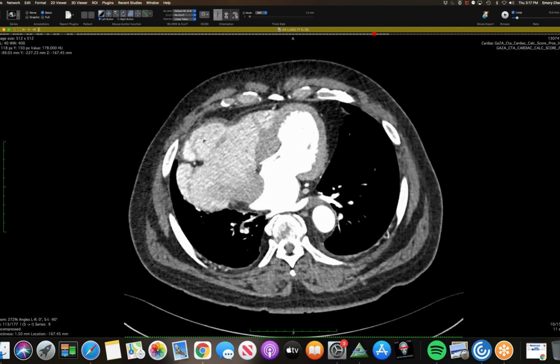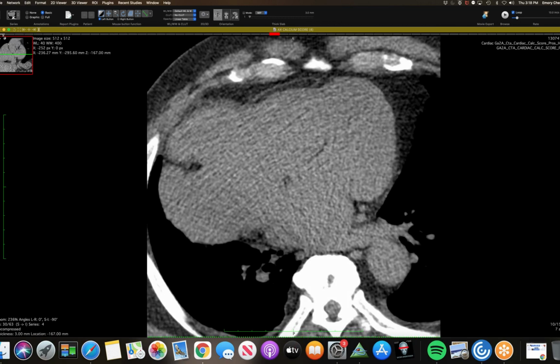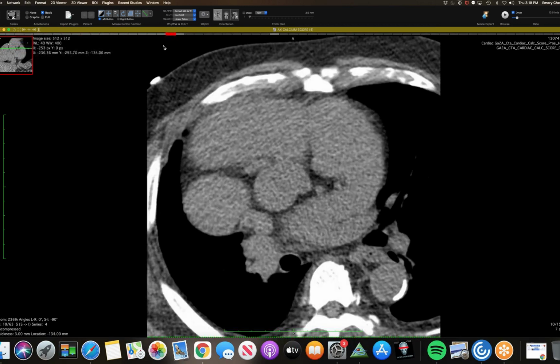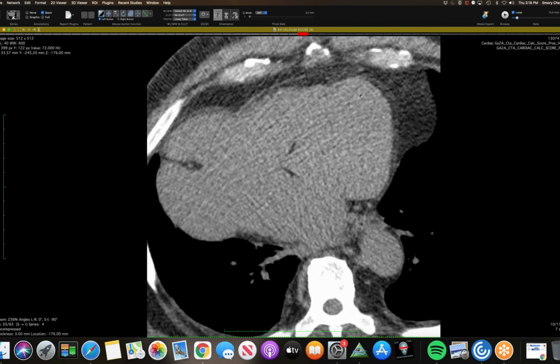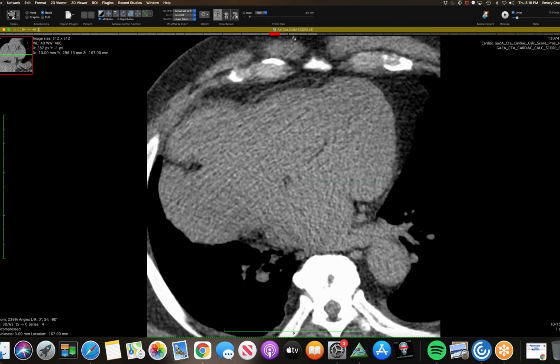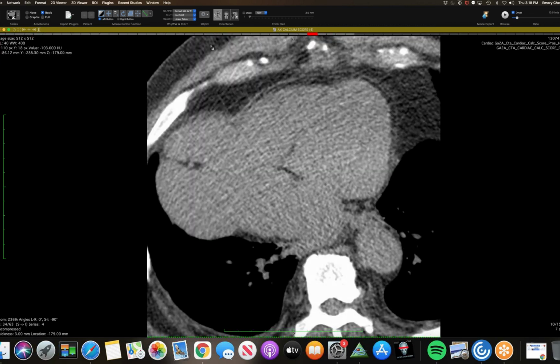You can see the outpouching here. Maybe it's arguably actually better seen on the non-con, also on the calcium score. So if you follow it down, you can kind of see the pericardium here, and then you kind of lose the pericardium. So this outpouching is from a partial congenital pericardial absence on the right side, which I hadn't seen, a right-sided absence there.